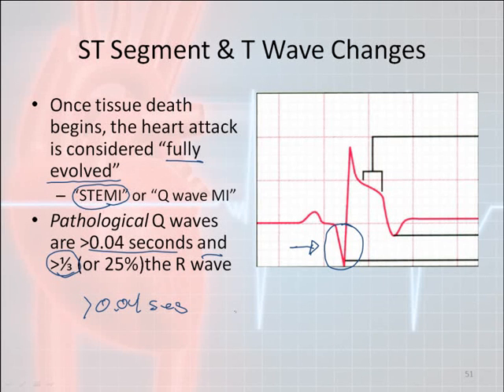If you look at the previous EKGs or the previous QRSs that I was showing you, you will have a cute petite little Q wave and the QRS and then the T wave. It's kind of hard to draw that. This right here tells me that it is ischemic. This tells me that it's infarcted. This is not uncommonly called a STEMI.